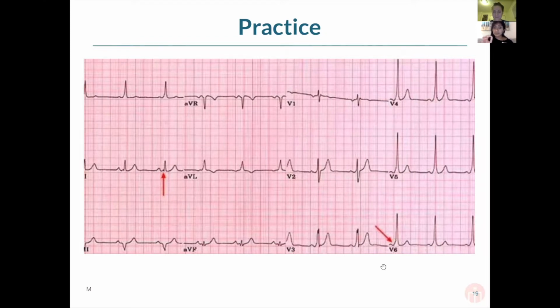Great point here is that you're seeing that delta wave with a slow uptick in that QRS. So it doesn't go straight up. You see a little bit of curvature before the QRS complex begins. And that's pathognomonic for one specific diagnosis, which we will get to. You also see a slightly longer QRS because of that longer initiation of that delta wave a little bit earlier. It's not super long. It's not longer than that 120 cutoff that we talked about, but it is a little bit on the longer side.